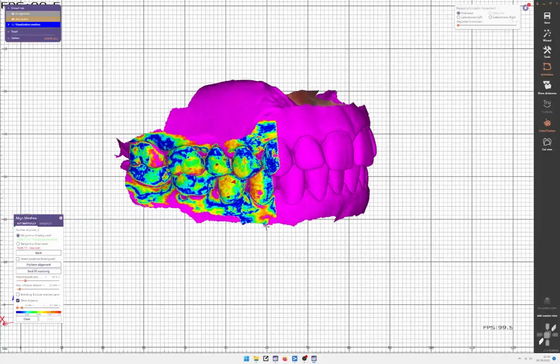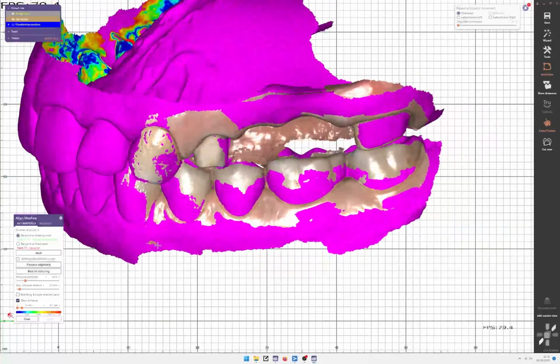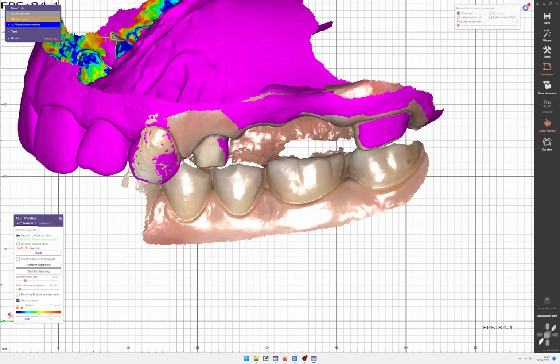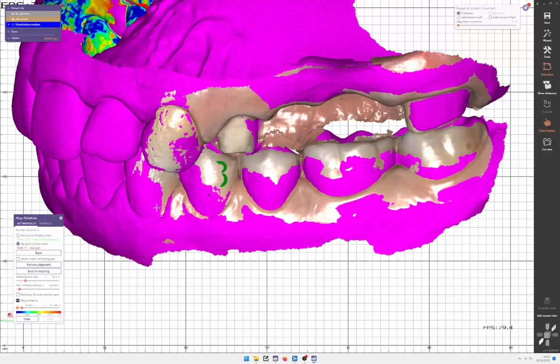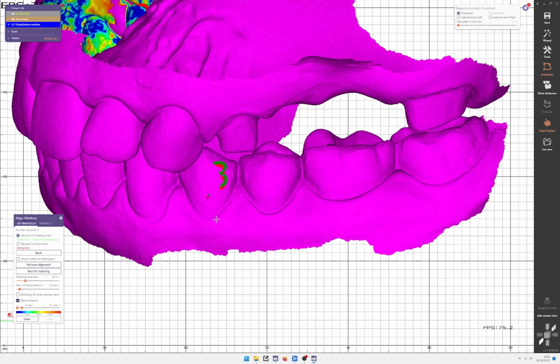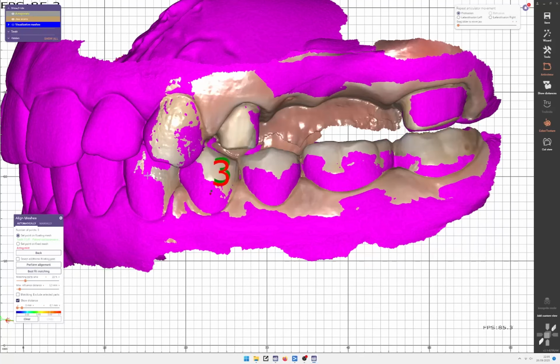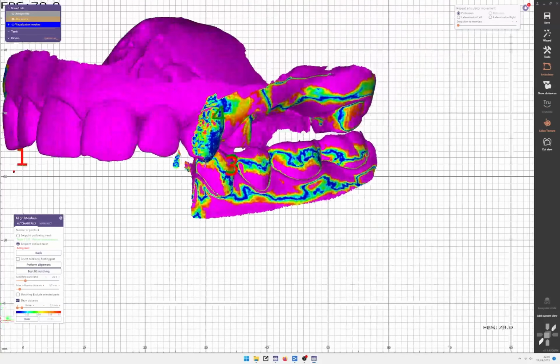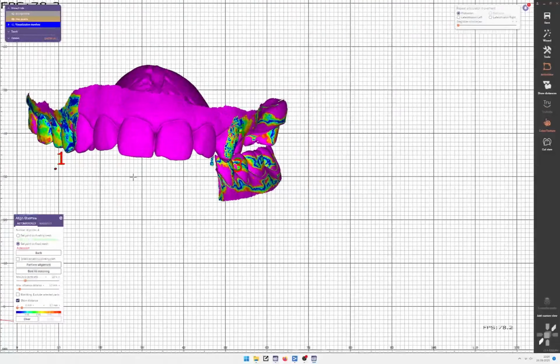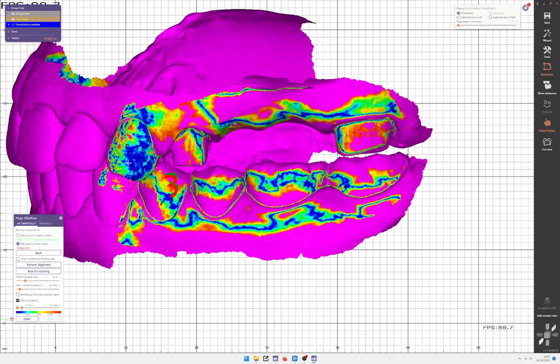Here on the other side now, we can do the same thing. We don't have to clear the data, we can leave the visualization there. We're going to click another point here, and then we're going to click another point on the lower one. And we're going to do the same thing here on the upper one. Click, and yeah, so now it appears. And here things get a little messier.